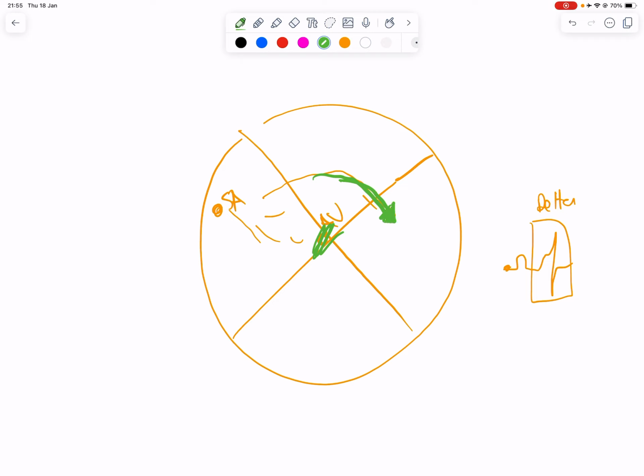So patients with Wolff-Parkinson-White, the important take home is that they have delta waves at baseline. So if you and I, if we don't have Wolff-Parkinson-White, we've just got normal QRS complexes, narrow QRS complexes at baseline, they have delta waves.